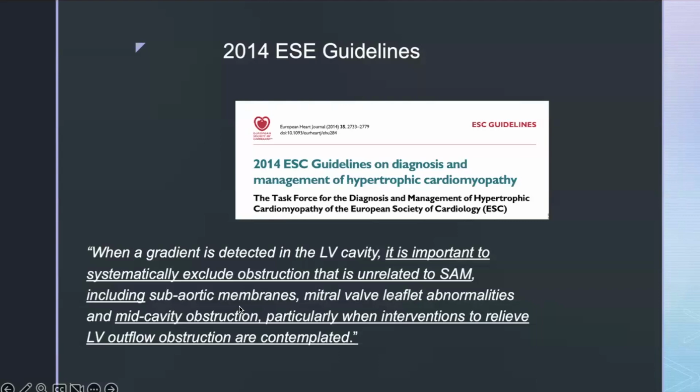There was a comment here, and I just want to incorporate it. Good to crank the color scale to see if turbulence persists if suspected gradients spot. Yeah, so that's a great idea too. If you're unsure, if you're going, I don't know if there's a gradient, you can, as Natasha's commented, increase the color gradient and see, and that might help you identify.